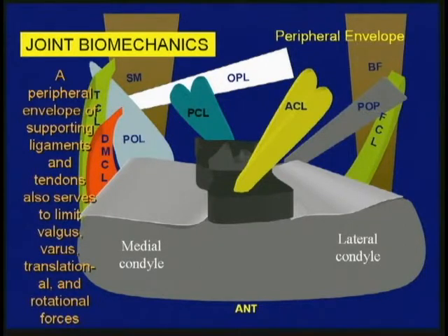Minnie will be talking in great detail about injuries of the collateral ligaments, the peripheral collateral ligaments, and spend time on both the posterolateral and posteromedial corners. Our analysis is made difficult not only because of the great number of structures, but many are obliquely oriented and many are close together and very fine structures, which makes it difficult sometimes to assess them directly.